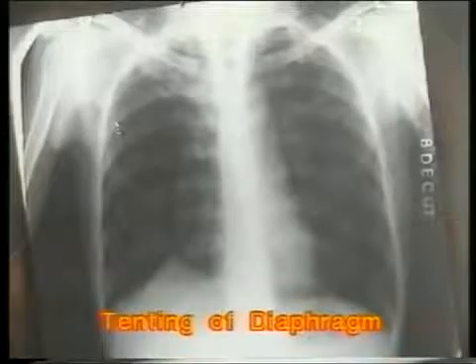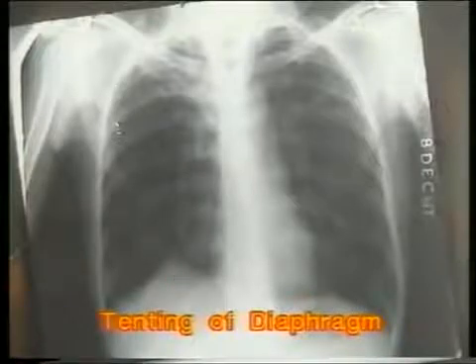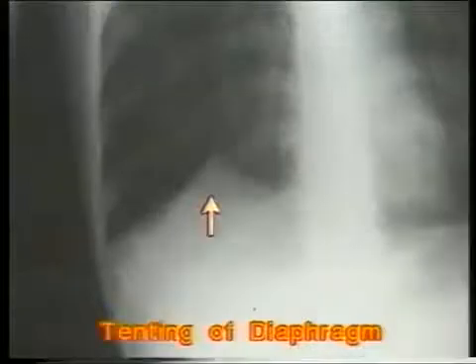When fibrosis occurs close to the diaphragm, it may become tented. If the diaphragm is pulled up at one point, it gets raised with a sharp angle. This is termed tenting of the diaphragm. Note the typical angulated tent-like appearance.